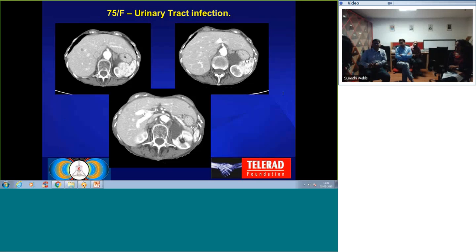How big were they? Around 1.3 centimeters. 1.3 maximum or 1.3 centimeters? And then you also sometimes see those bright spots which are ill defined, and those I usually see in patients who have some kind of liver disease. I don't see them in normal livers. I usually say non-specific enhancing foci, especially less than 1 centimeter, or if they're 5 millimeters or so, I just bury it somewhere.